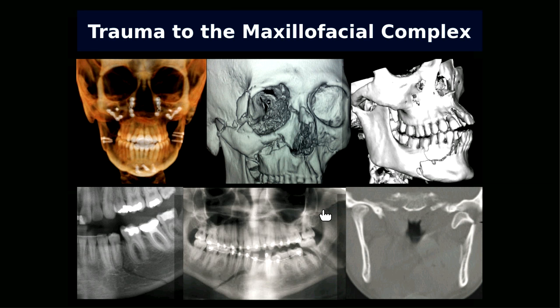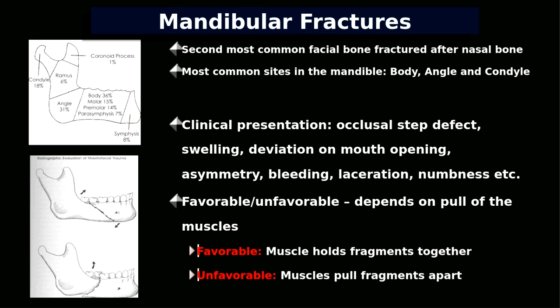And for the people who are interested in oral surgery and in fracture management and surgery, you can also see if the condyle is broken from the condylar neck. You can see a condylar neck fracture here. Also the maxillofacial fracture you can see. And the pan is also good to see the fracture. Sometimes it's deceiving. We may miss a fracture too.